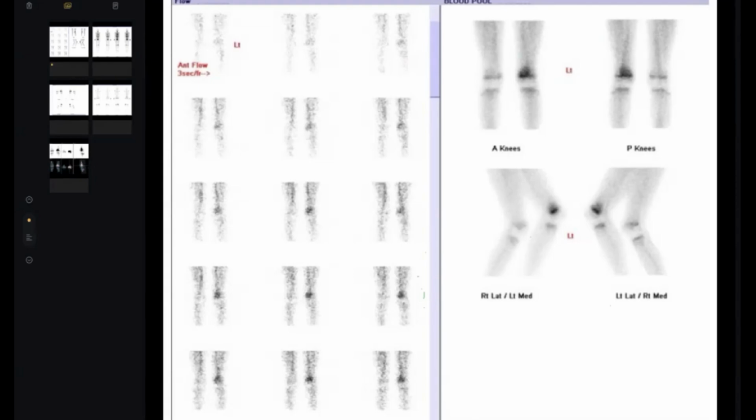Hello? Doctor. Sorry? Yes? What is this? Two lesions show uptake in the three phases of bone scan. First one, osteomyelitis. Next one, three phase. It's not in my mind now. I'm sorry. Stress fracture. Stress fracture, yes. Okay. Thank you, doctor, so much.